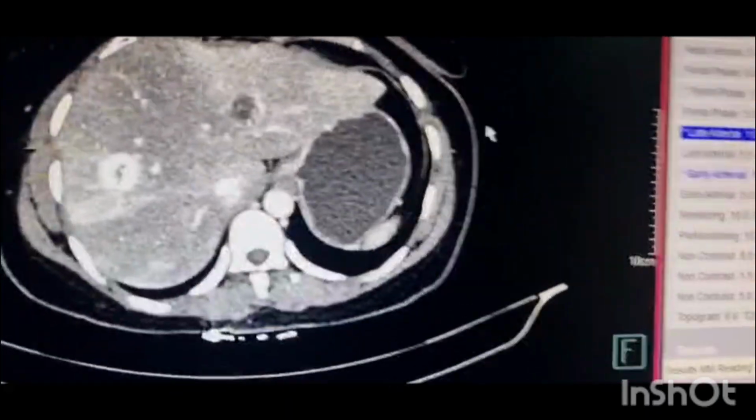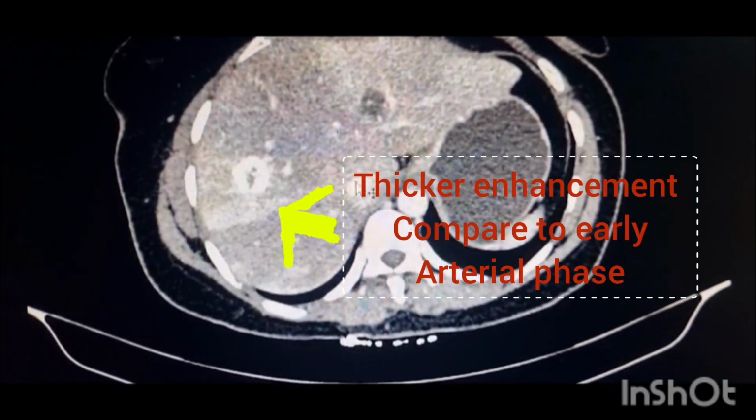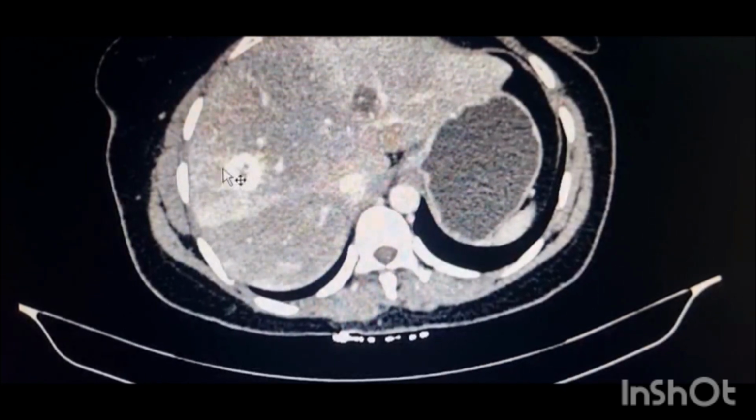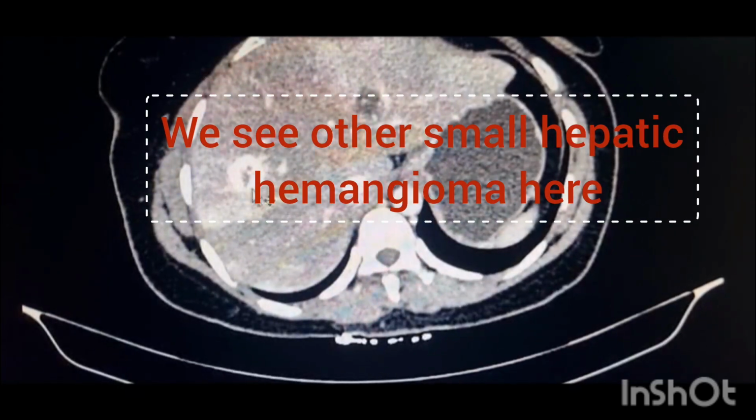In late arterial phase, we can see here that this filling and enhancement become progressively more, and a thick band of enhancement we can see, but still in the central part there is a hypoenhancement.